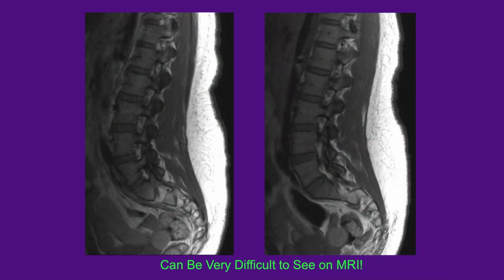The point here is they can be very difficult to pick up on MRI, and this particular pars defect was missed on MRI, only picked up later at subsequent imaging.